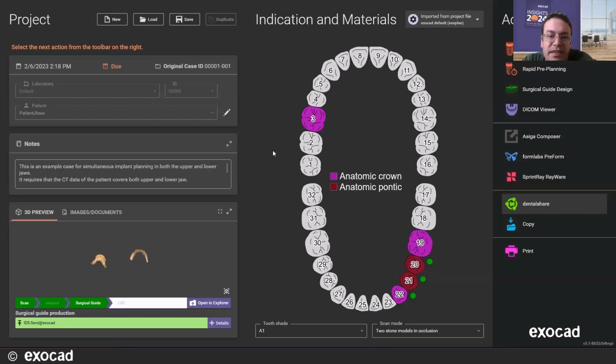So the case that Dan just finished up, if you also have DentalCAD software installed, you can just take this same case, start it up in DentalCAD, and there are guided workflows in there that will let you design the temporary restorations or your immediate load parts. Yeah, and if we would have taken the time to do the tooth placement that we skipped earlier, you could actually bring that initial placement into DentalCAD with you and then adjust accordingly within DentalCAD. So that's pretty cool as well.